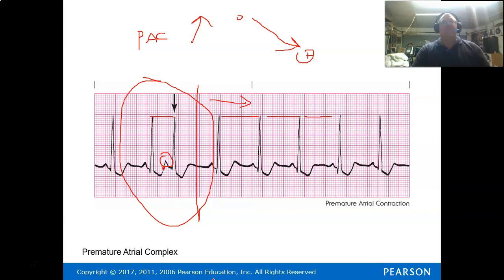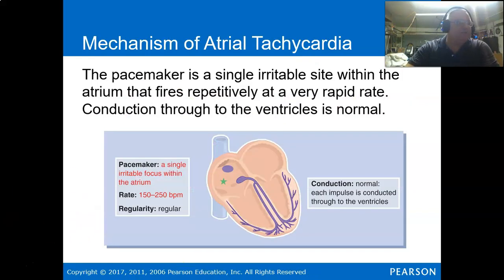Again, it's usually due to some sort of irritable focus in the atria, a little spot that's firing off because, for some reason, it's irritated. But again, most of the time, it doesn't cause too many problems. All right, not to be confused with this guy right here.